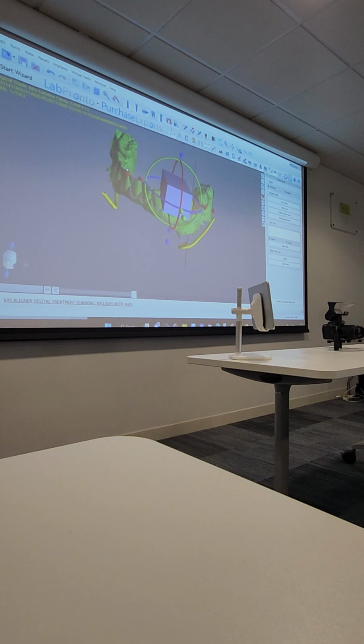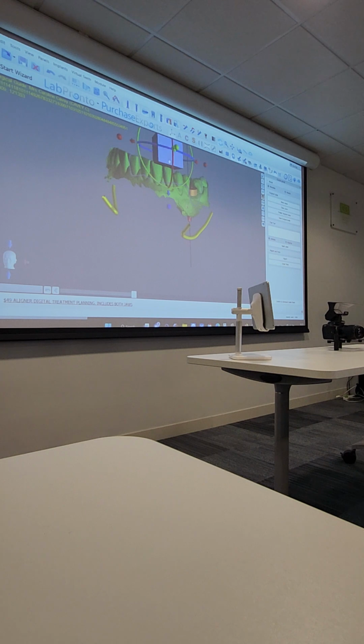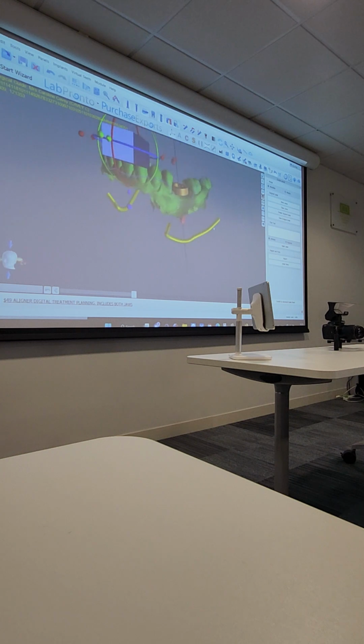But I normally tend to keep it maybe around this size. All I want is to be able to see a few teeth so I can ensure that my guide is fully seated. So I normally put it around this height. Maybe slightly wider. Fine. Happy? That's it. Create surgical guide. Press on create surgical guide.